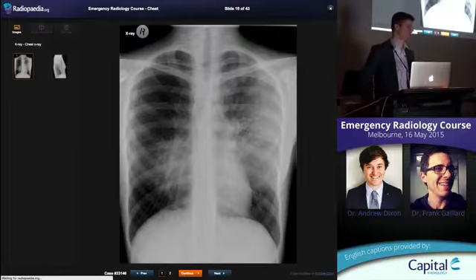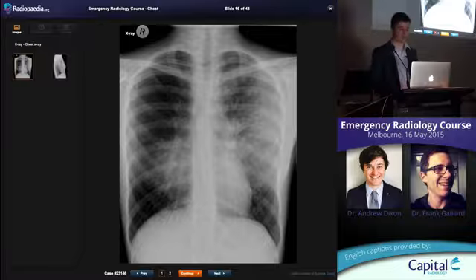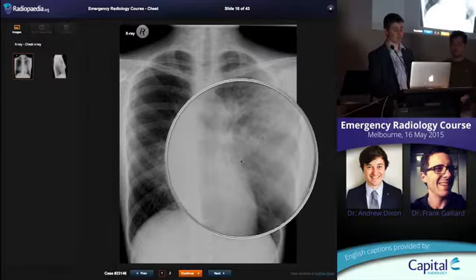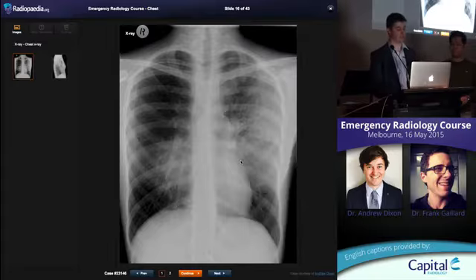And this was a tricky case. This is a case again where I show it to the registrars before they go to their exam, and beads of sweat sometimes appear. This has got presenting with cough and fever. Nice example of consolidation here with little branching black things, so air bronchograms. Starting to lose the left heart border, so we're thinking this is a left upper lobe pneumonia.